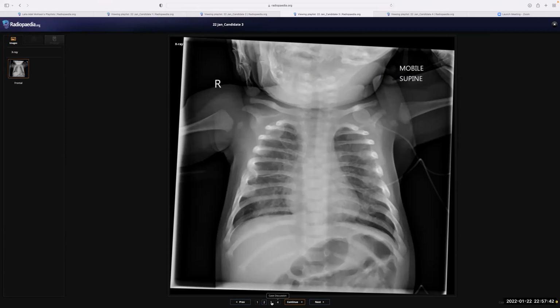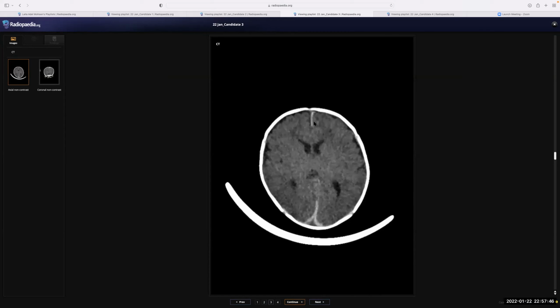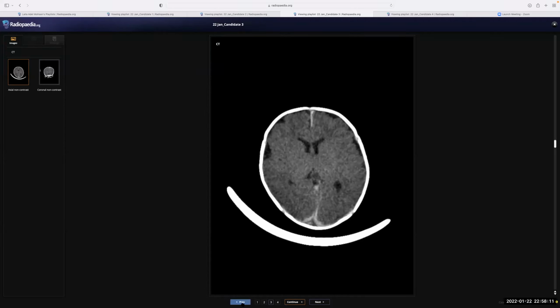What else? And yes, for the skeletal survey and the scan. The CT scan here, you mentioned this is a subdural hemorrhage and diffuse edema of both cerebral hemispheres. Okay, try to take it quickly, so we don't need to repeat the findings. So these are the subdural and this is edema, so the child needs urgent referral to the pediatric neurology team, and that's it. Okay, thank you.